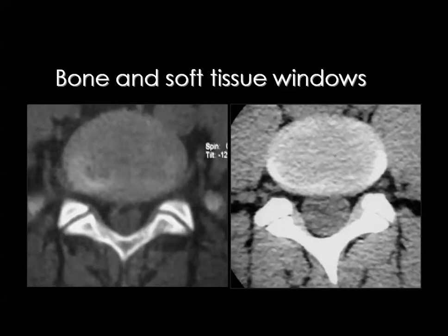And these are the spinal images or scans, which should be obtained in the soft tissue window setting as well as in the bone window setting. Whenever we are evaluating the spine, we usually ask ourselves what we are going to evaluate, and if this part is a bony part or a soft tissue part.